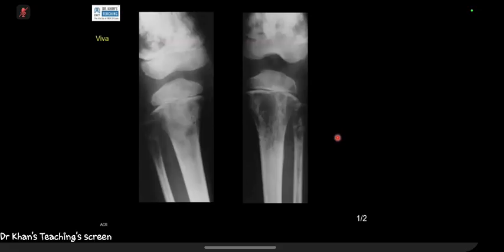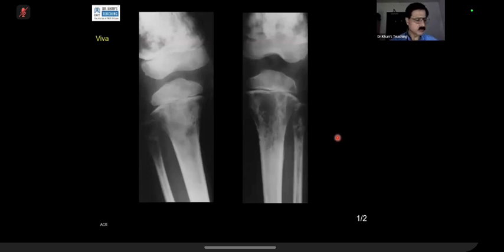There is a line. Maybe this is a fracture line, I am not sure, seen in the proximal end of the fibula. This is serpiginous. I think in the tibia there are serpiginous changes in the metaphyseal sclerotic. So, what is your conclusion? This is maybe also the same as sickle cell anemia, I think. Okay. Thank you.